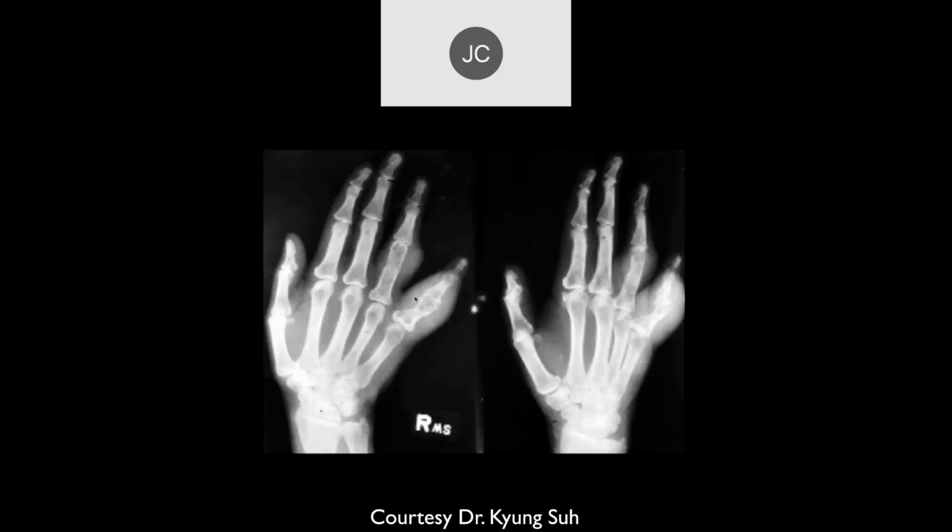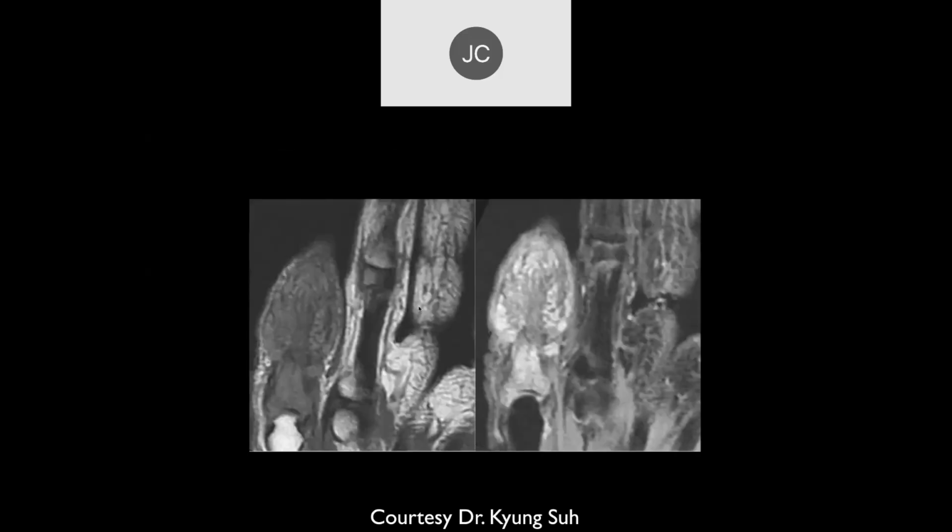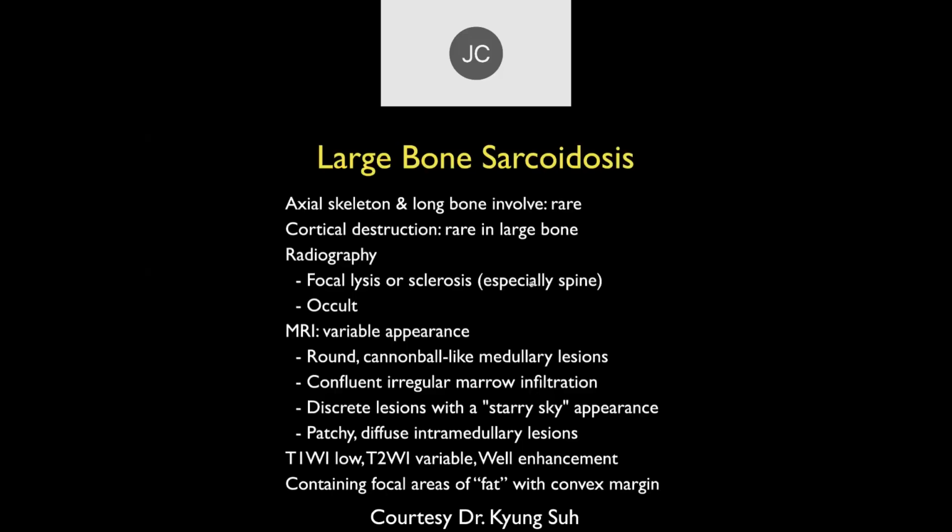And that's another example, sarcoid with involvement of the soft tissues around it, a little bit of calcifications within the soft tissues. Again, here we can see bone involvement as well as soft tissue involvement. And here the appearance is not typical of the usual infection that we see. It looks almost more tumor-like in its characteristics.